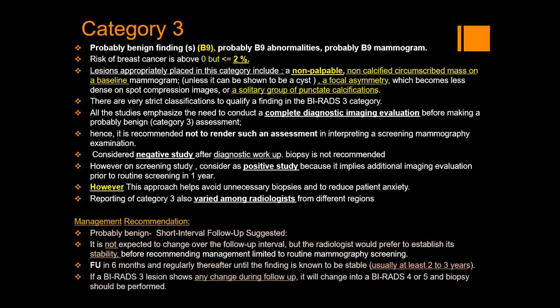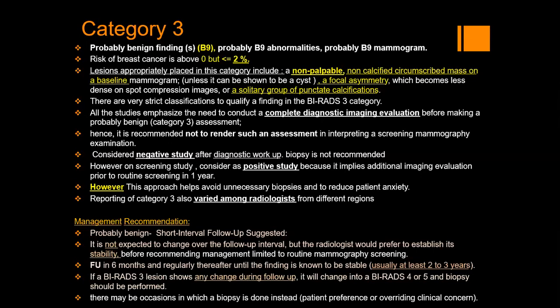We said if there is any change while screening, we have to upgrade the lesion to BIRADS 4 or BIRADS 5. And sometimes for BIRADS 3, we might do a biopsy, according to the patient's willingness or the physician. In this case, we still report it as category 3, where instead of follow-up, biopsy is done due to patient preference or her clinicians.